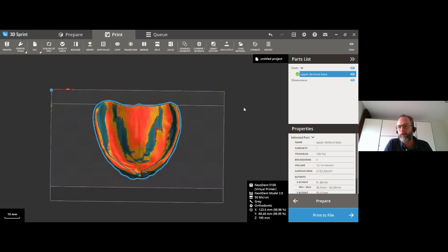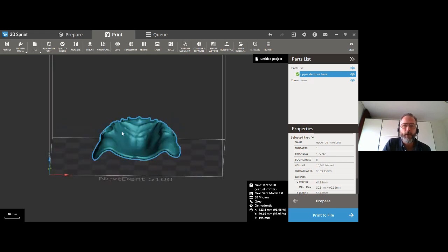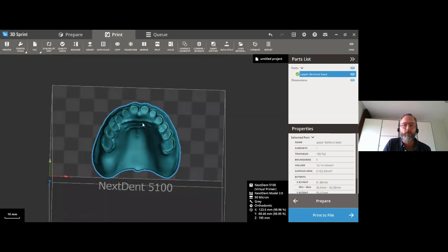but you can also see, because we all still have the down-facing surface on, that in this orientation, there will be a lot of supports inside of the denture. So this is, of course, not what we want. Although the support tips are very thin, you would affect the fit of the denture. Now, if you would flip it, then you will have the same issue with the teeth pockets. So the supports will be in here, and that will make fitting of the teeth kind of challenging.